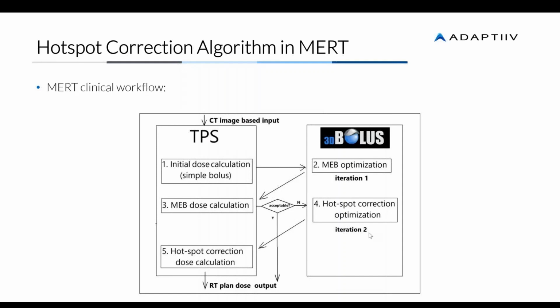So as you can see here, the workflow involves some going back and forth between the TPS and our software. At the moment this is the workflow, but hopefully our MEB module together with the hotspot correction algorithm will be accounted for in future commercial treatment planning systems.